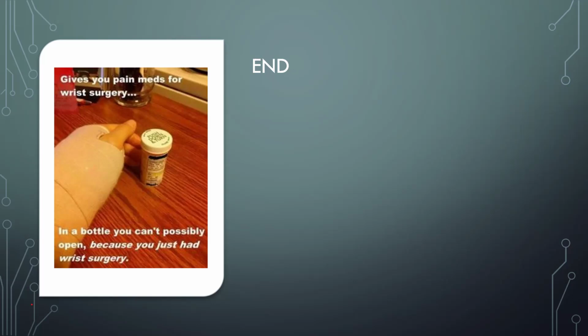Now, generally, the good part is most of these patients, there's obviously a lot of pain, a lot of swelling. You would suspect something. And the majority of doctors, especially junior doctors, would at least show this to somebody and say, listen, this patient is obviously, there's obviously something wrong. I just don't know what it is. But it's much nicer to be able to go to an orthopedic person and say, listen, this patient has a lunate dislocation. Now, even if it's a lunate and you say perilunate, they laugh to themselves, but at least they'll respect you for realizing something was wrong.